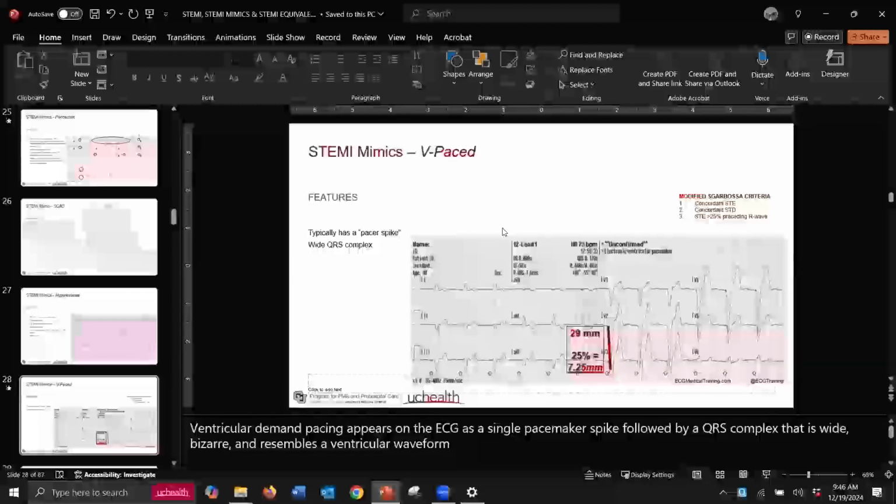So, ventricular paced rhythms. I've been doing this a long time, and I've got a story about me. Is it dog ears? Well, I know it's not dog ears. I hate dog ears and rabbit ears and every kind of ear. They ain't no ears. I have never seen an ear on an EKG.